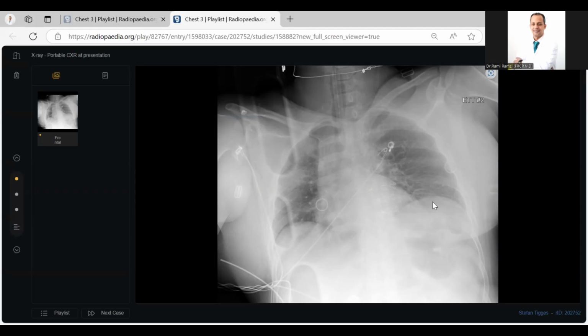An endotracheal tube is seen in situ. The trachea appears to have a normal airway, outlined by air. Now I'm looking at the bilateral lung fields.